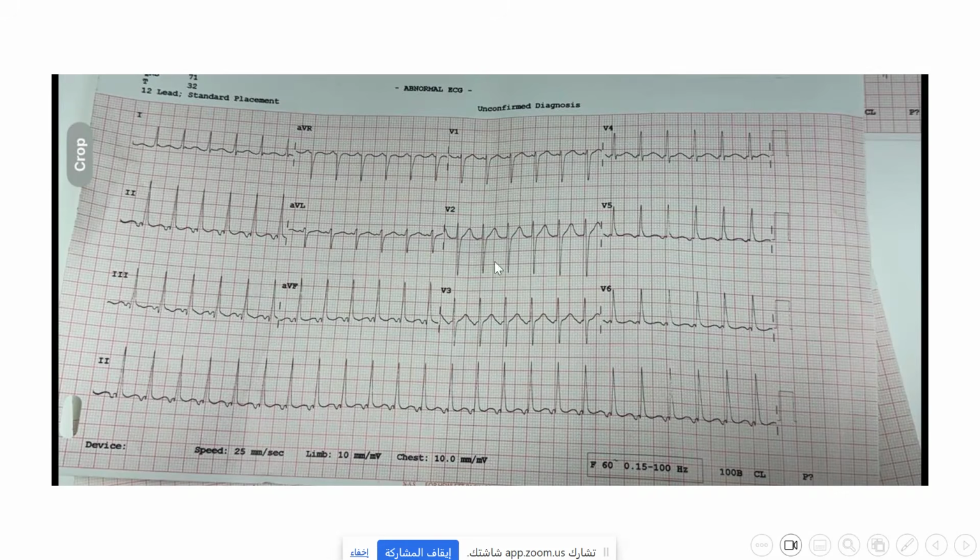By the way, this is ablated; there is an accessory pathway, usually in the posterior septum, and this is called permanent junctional reciprocating tachycardia. It is common in young patients, and they usually present with cardiomyopathy because of tachycardia-induced cardiomyopathy. After ablation of the accessory pathway, treat the patient for a while, and he will completely recover.